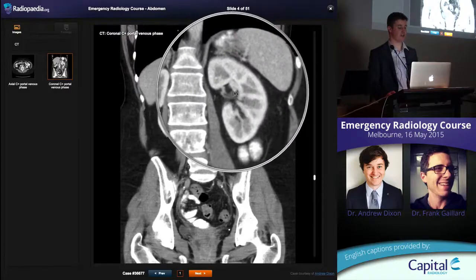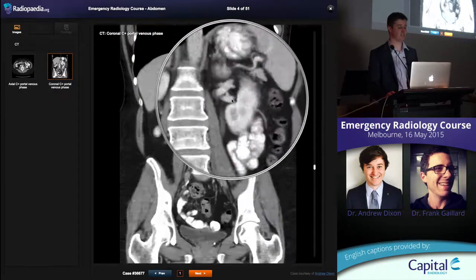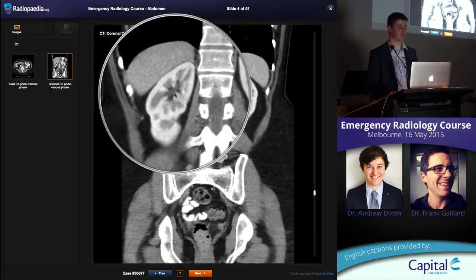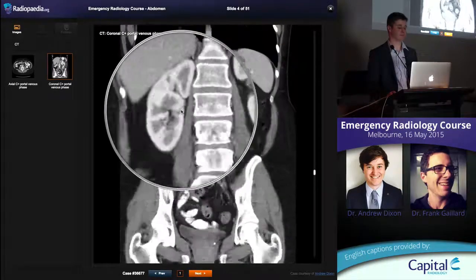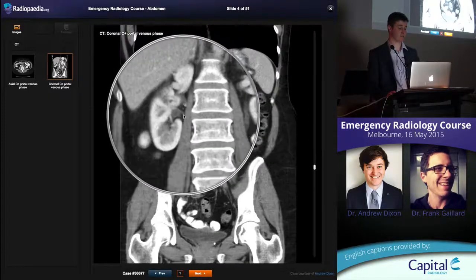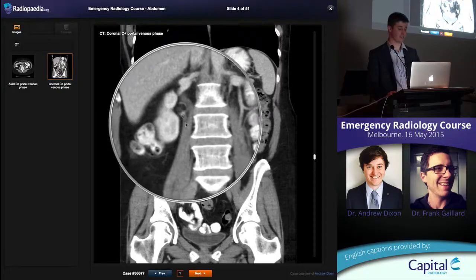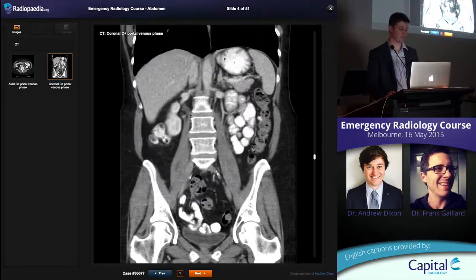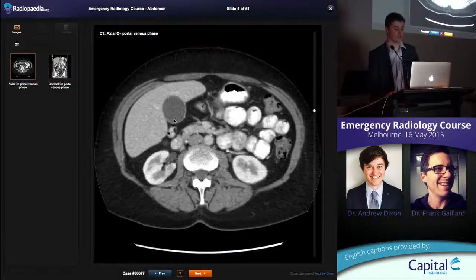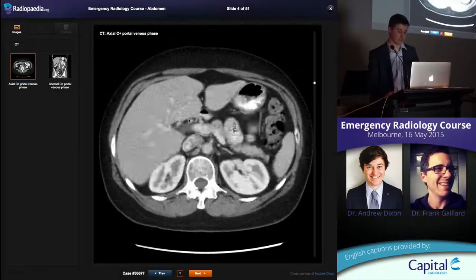You see how you've got nice black fat coming in through this kidney? That's a sign that there's no hydronephrosis. Here's the little calyces going in here with little black fat around it. Okay, seems to be a little bit duplex, this one. You can see two pelvises coming together. So that's the kidneys. We'll learn a bit about tracing ureters later on when we get to renal colic.